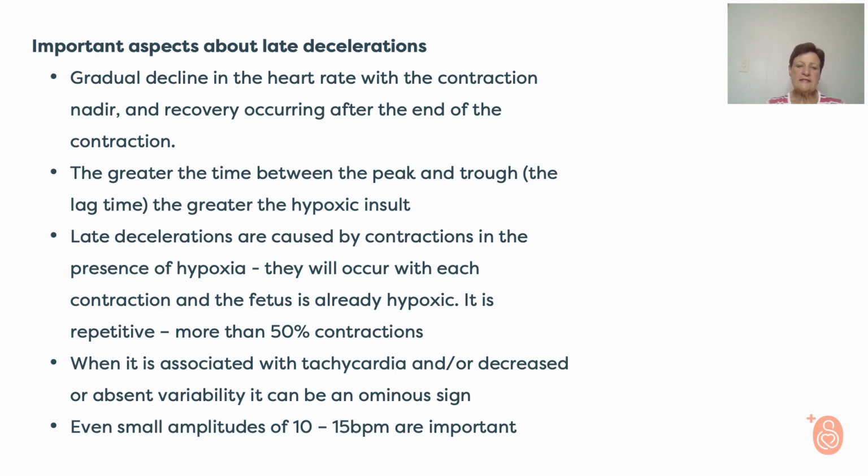Now, when these late decelerations are associated with tachycardia or a decrease or absence of variability, which are also bad signs of hypoxia, we say this can be an ominous sign.